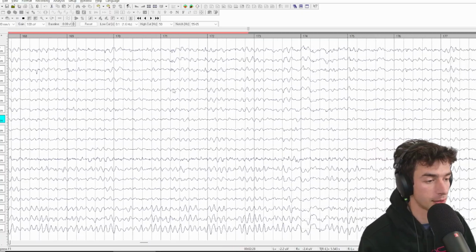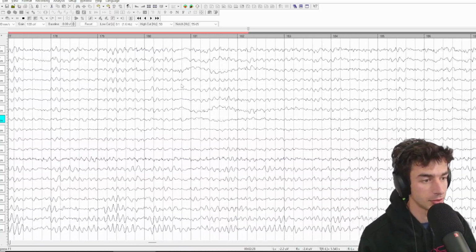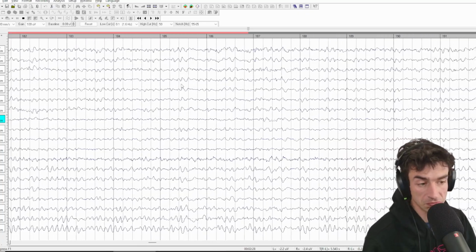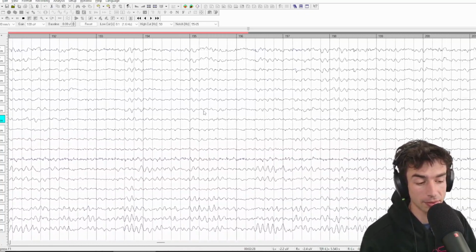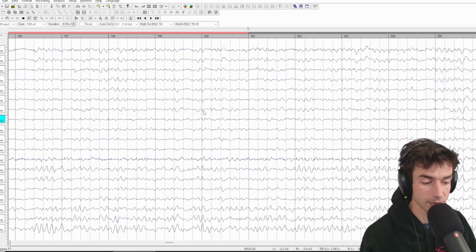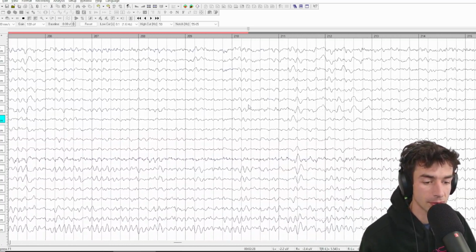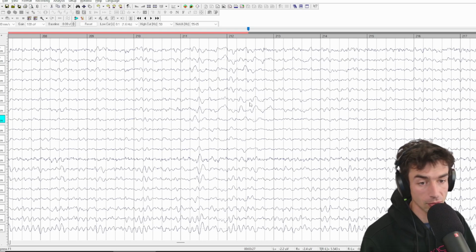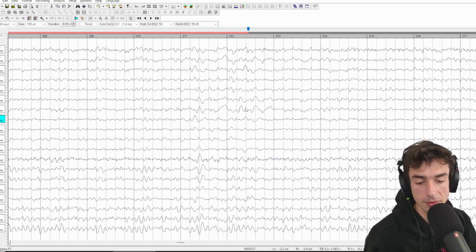And theoretically, it's possible that that burst of frontal theta is also associated with a shift in vigilance that may prompt some eyelid flutter. I don't know. Right? This is where video EEG can be a little bit helpful, and or having an additional sensor or two on the face.